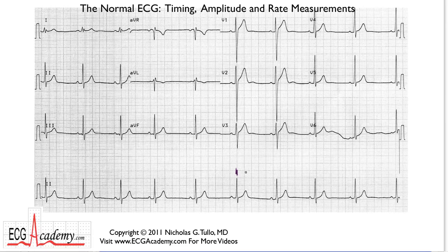So if you count off, we can say 300, 150, 100, 75, 60, 50. So if this is 60 and this is 50, you have to kind of call it 55 or so. And that's what we came up with when we did that mathematical calculation. Okay, so it kind of makes sense to do this. Well, let's try it again.